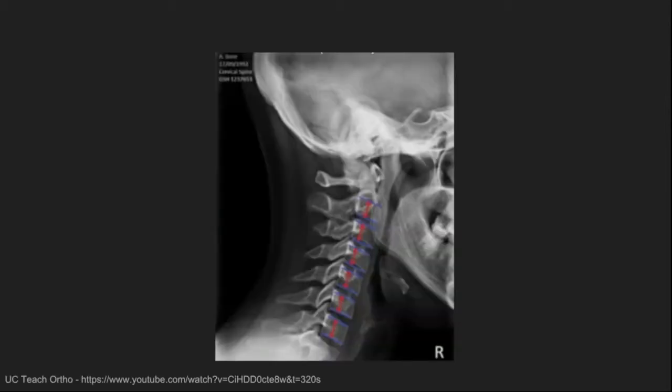Now we look at the vertebral bodies and their accompanying disc spaces. Look for loss of vertebral height signifying a compression fracture. All bodies should be approximately the same height, though note that C1 does not have a vertebral body. Also look at each corresponding spinous process and the disc spaces. The disc spaces should also be more or less the same height. A narrow disc space can suggest that extrusion of the disc into the spinal canal has occurred.